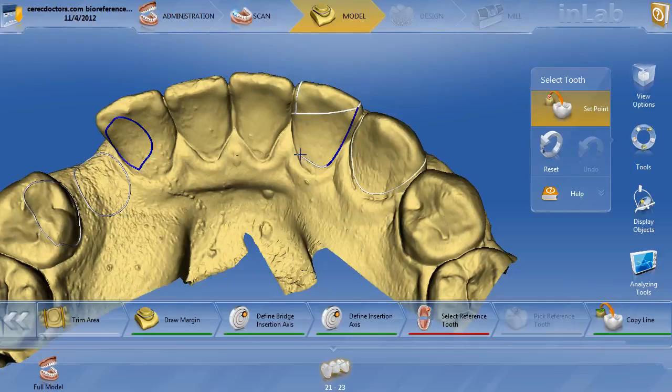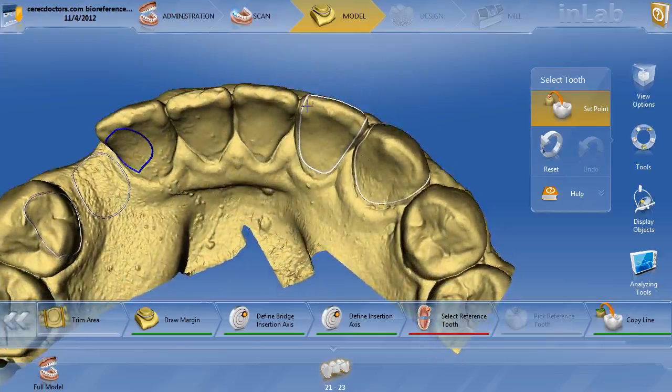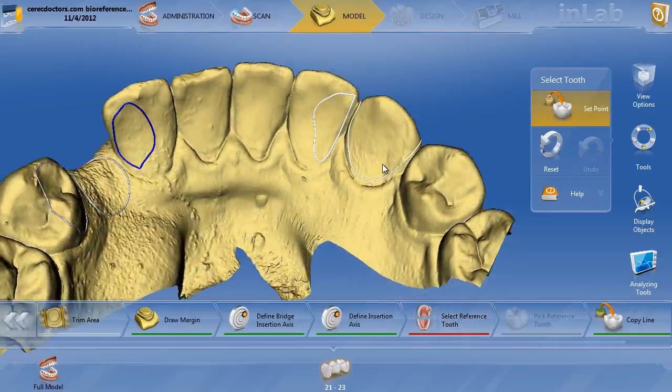So if you ever have that happen, what that means is that it always is going to cut away the smaller portion, so we might need to start there. But since we're doing a wing here, the only thing we really need to have it reference is the little wing area, like that. So we'll keep it just like that.